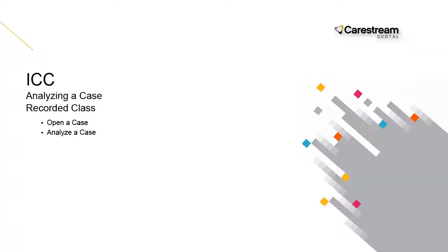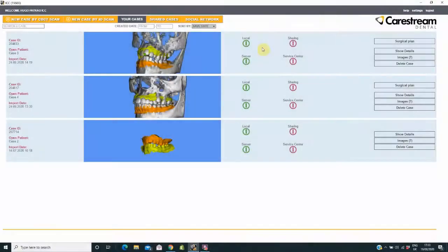ICC. Analyze a case recorded class. This recorded class is designed for clinical team members. It provides instruction on how to open and analyze a case using the 2D and 3D image functions in ICC. We will examine a case to identify how we can change the visualizations to analyze and assess the case.